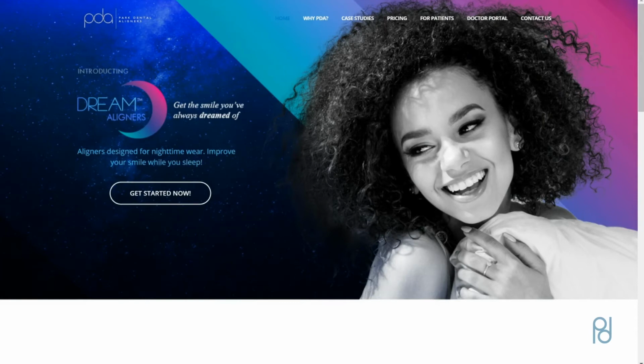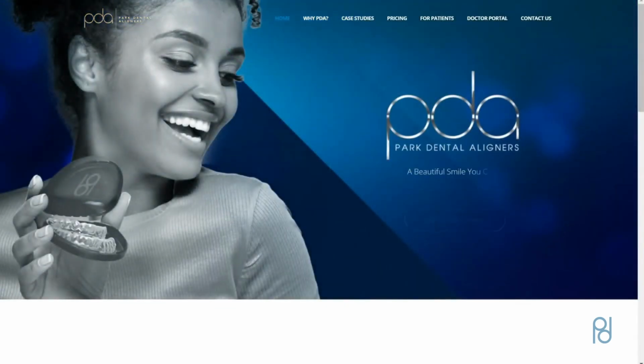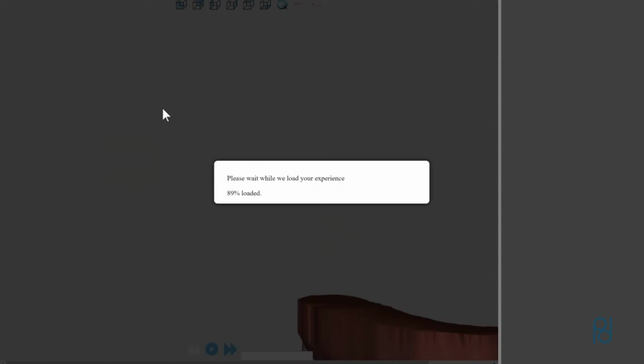This video will guide you through the approval process to authorize manufacture of aligner kits for your patients. Once the treatment plan is completed, you'll receive an automated email from EasyRx asking for your approval for the treatment plan. This email will contain a link to view the entire treatment plan as an animation.